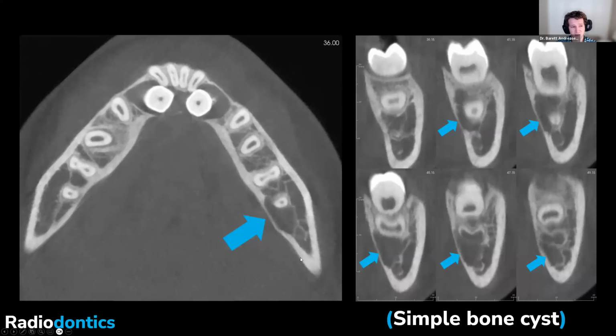One of the things that I'll also point out is if you're just looking at the trabecular bone, it's not really going to help in this case. This patient, for whatever reason, just anatomical variation, they have a lot of large marrow spaces. So these large radiolucent areas are where just marrow is present and very little trabecular bone itself.